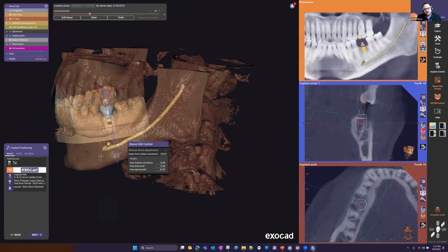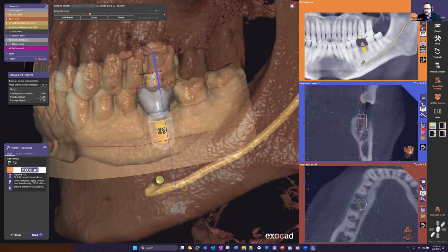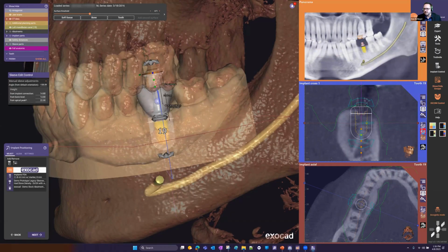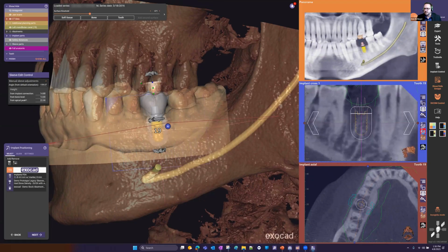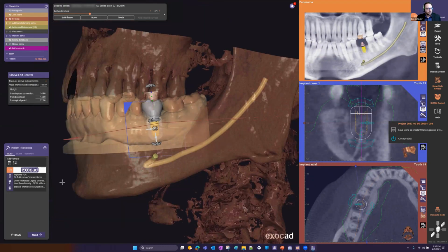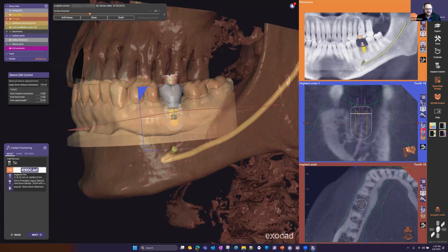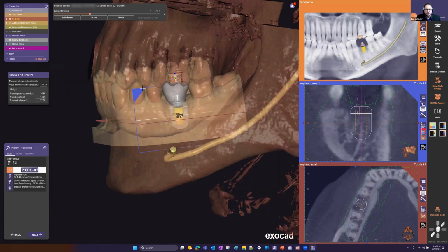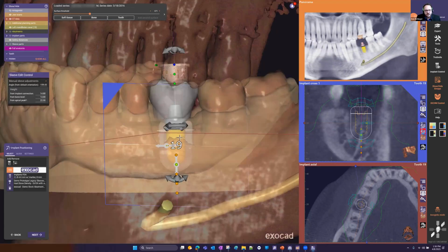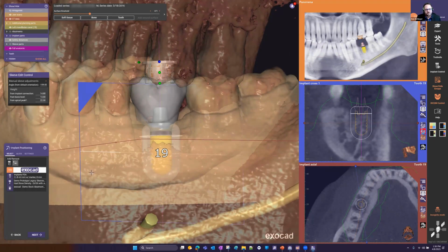And with any steps that you've done in rapid pre-plan mode, you're not going to have to repeat those by default, except for implant positioning. So this is your last opportunity to adjust your implant placement to make sure you're supporting that tooth library design you placed. So from here, I'm not going to necessarily worry about perfect placement in this webinar, but that's based on the doctor's discretion. So we're just going to go ahead and proceed with the setup that we have now.